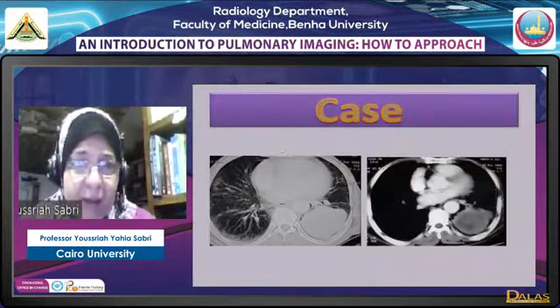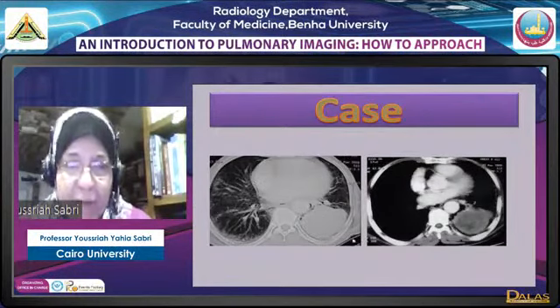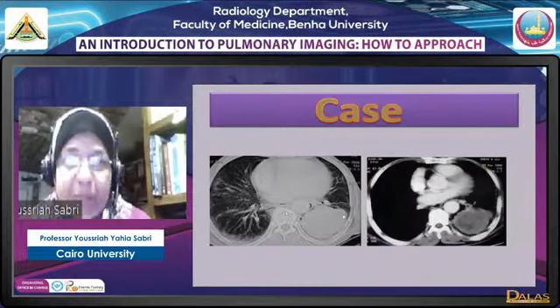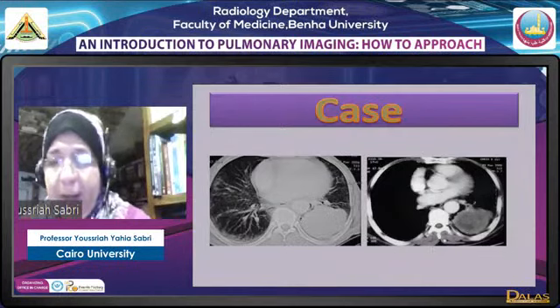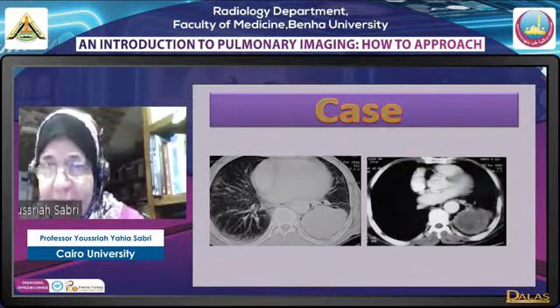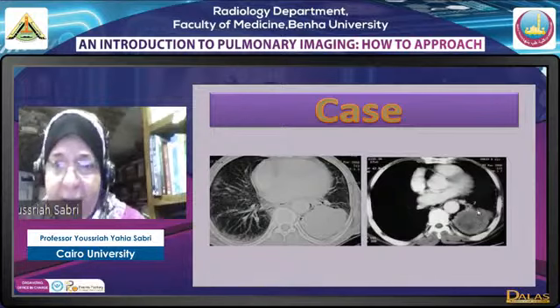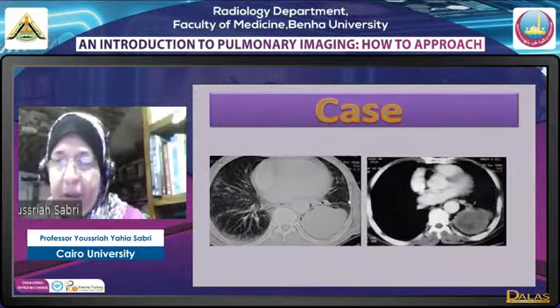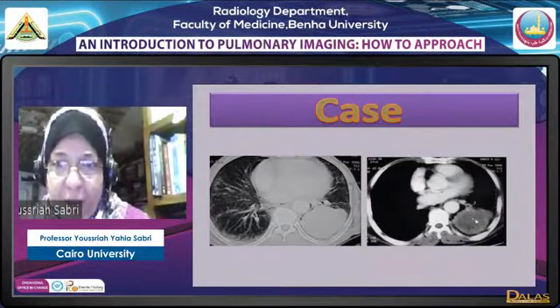Another case here: we have a 65-year-old male smoker with interstitial fibrosis and a rounded lesion opacity here. This is a mass with partially well definition and partial lobulation. When we come to tissue characterization, we find on CT with contrast heterogeneous enhancement, and here there is a prominent extra pleural space, a sign that may suggest malignancy. Again, this is a male patient, 60, smoker, so I will immediately think of it as a mass, and bronchogenic carcinoma is to be considered.